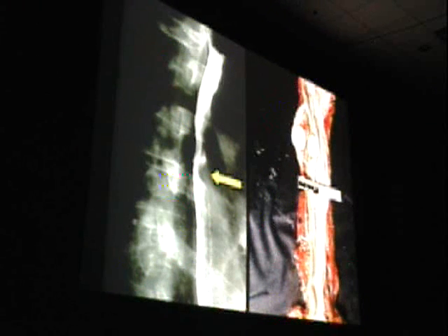Leiomyoma, most of these are discovered incidentally. They basically indent the wall but do not displace the entire axis of the stomach like an extrinsic lesion can do. And many of these are discovered incidentally. Remember that in the esophagus, they're leiomyomas; elsewhere in the GI tract, they're gastrointestinal stromal tumors. And nobody understands that. 75–80% of all submucosal masses we see like this are leiomyomas in the esophagus. In the rest of the GI tract, it's exactly the opposite. They're all GISTs, and nobody knows why.